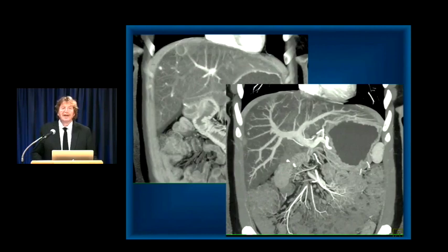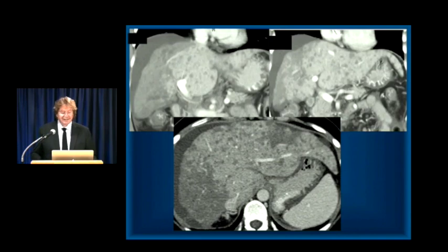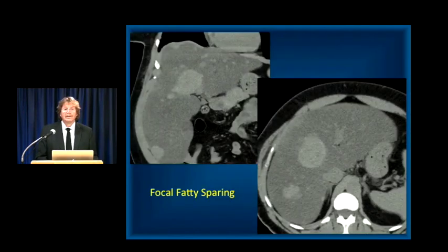Now, sometimes those hypodense lesions look relatively vascular, at least the periphery, because it's relative to the edge of the normal liver. And you can see in a case like this, another example, multiple tiny cysts within the liver, as well as areas of fatty infiltration, as well as areas of metastasis, or in this case, focal sparing in a patient with metastatic disease.